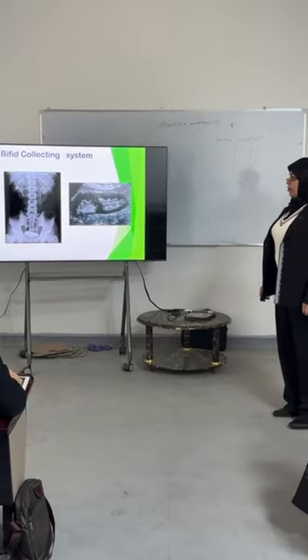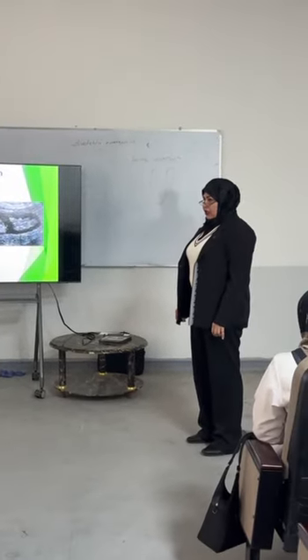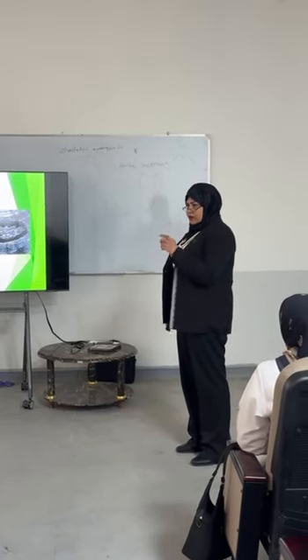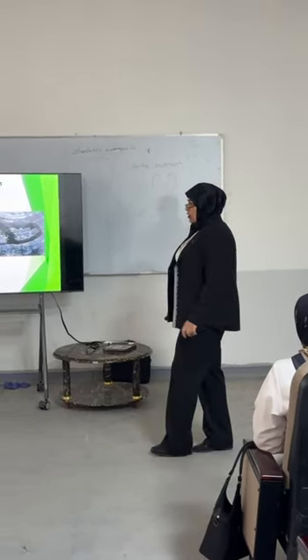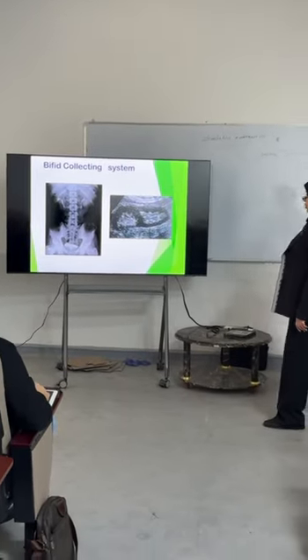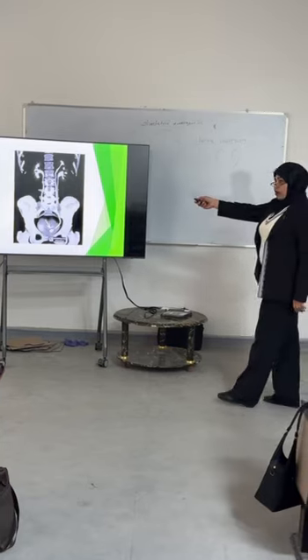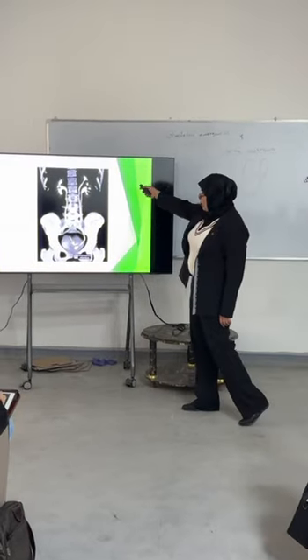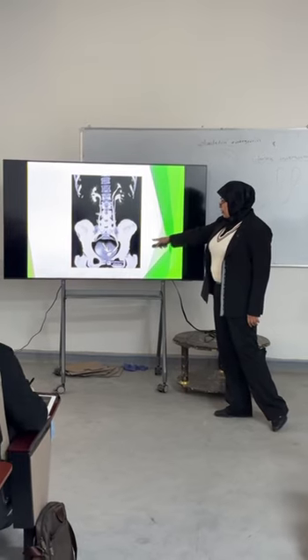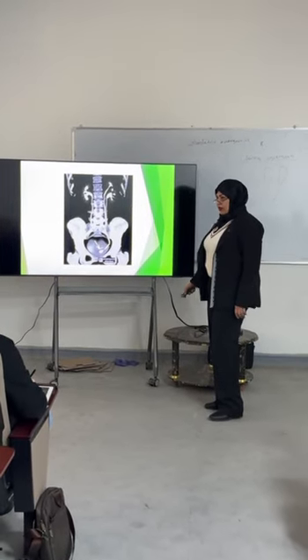This is duplication of the pelvicalyceal system. It may include just the calyces or the calyces and upper ureter, or it may extend down to involve the whole of the left ureter. What is this structure?